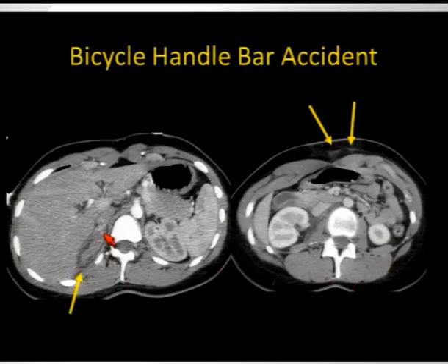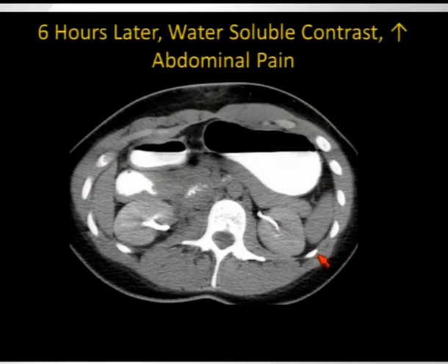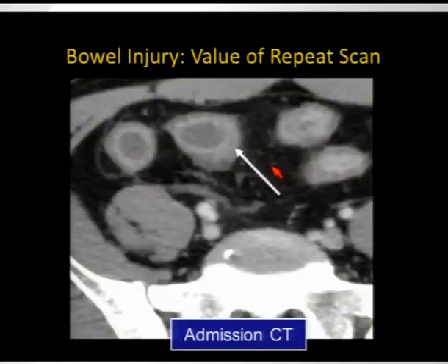Another similar patient, adrenal hematoma, always remember, significant injury. There is mild thickening, but especially some fluid outside of the duodenum. With this finding, the decision was made to admit the patient, observe. Only 6 hours later, the patient already developed some increasing abdominal pain, we repeated the CT, and here we have a contained perforation in the duodenal wall, and the patient at that point was operated on. Notice also an abdominal wall hematoma, always a sign that there may be a significant injury within the abdominal cavity.